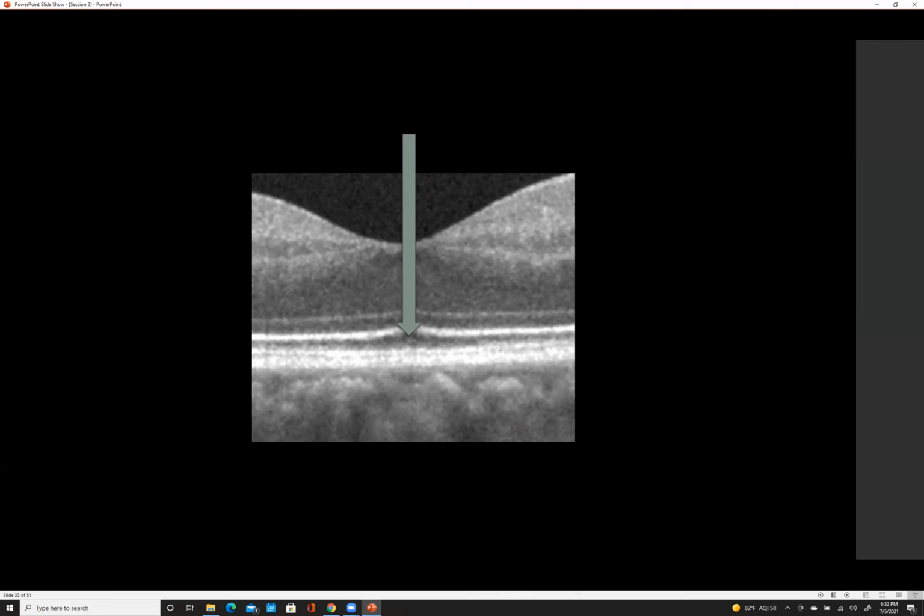And so two reasons. As you were saying, the cones are shaped structurally in a way that allows for more passage of light, but then also they're photoreceptors, so they don't reflect back as much light because they're absorbing it. So the passage of light also means they're not reflecting back, because it's going straight through. And if it does make contact, it gets dark because it's being absorbed.